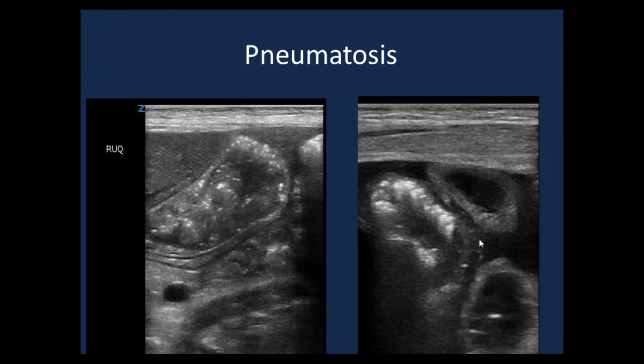And in this image we can see multiple loops of the intestine, and the signature is lost. So that's a sign of significant ischemia. We have a loop, another loop, and a third loop, and these loops are floating in peritoneal fluid, which is black and hypoechoic in ultrasound. And this loop is extensively affected by pneumatosis compared to the other loops.